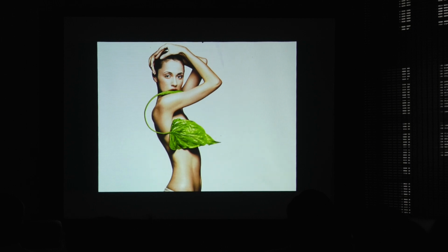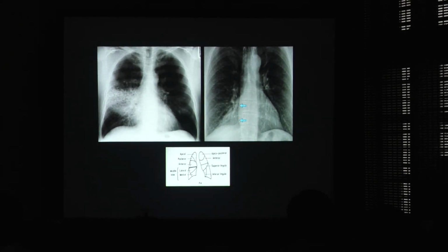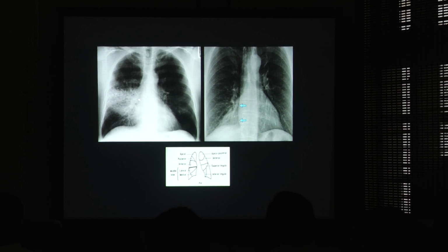I may not be able to unveil the entire thing within the stipulated time, so I will be touching upon important things. Now, this is an X-ray. Would you pass it as a mass or a parenchymal lesion? Yes, some response? Yes? Parenchymal lesion, good. So, we can see this is a typical appearance of consolidation. I can see air bronchogram also. So, here it is touching the cardiac border, inseparable from the cardiac border.